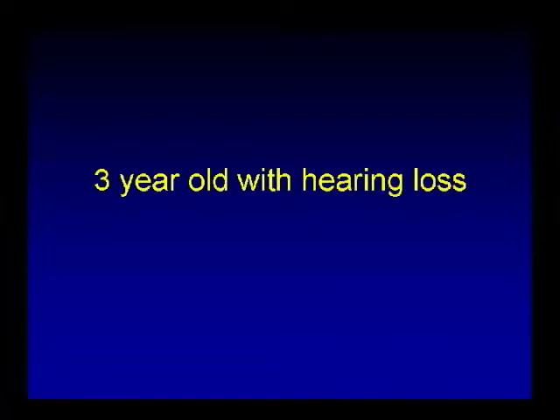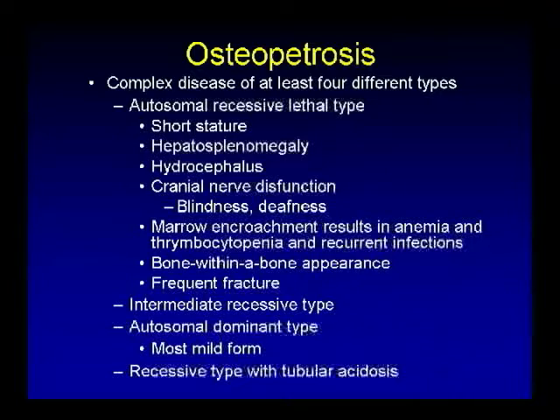Next case is a 3-year-old with hearing loss. We have very dense bones, and I think this is a beautiful example of a bone within a bone in the iliac bones here bilaterally. And this is osteopetrosis. This is a complex disease.